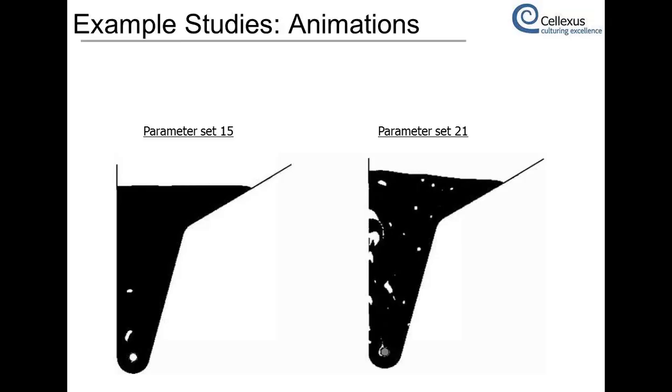Anyway, after a number of simulation runs, we ended up finding an optimized parameter set. Of all those parameters that we varied, I think we ran in total about 62 models. We ended up getting a model that was giving us very close correlations to ideal optimized solutions. And we're currently building the bioreactor with these particular parameters to actually physically test and assess with high-speed camera footage.